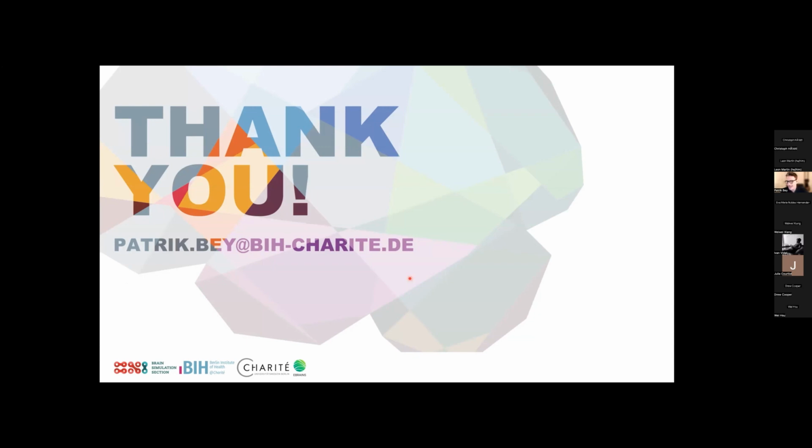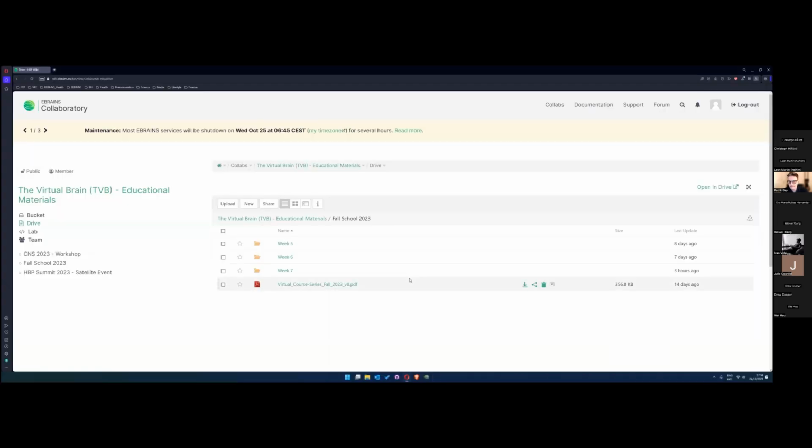And as I mentioned, I'm going to have a short sort of hands-on session. I put the material for this in the Colab. I think you've seen this before, right? It was last week with Dennis in week 7. So I put a little bit of code and some data here. See the data as these three NIfTI images, and the code, which basically contains the Dockerfile and the registration experiment that we want to run. And I'm just going to go through this now.